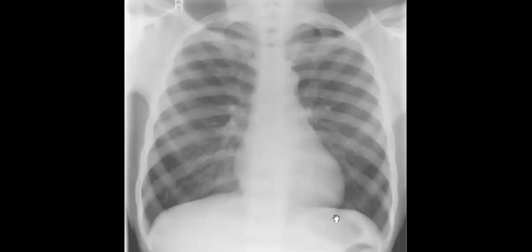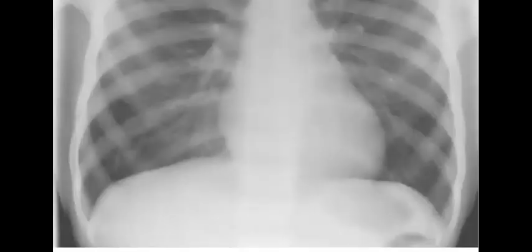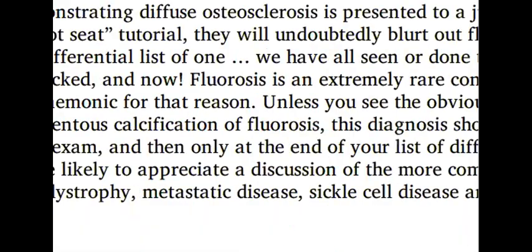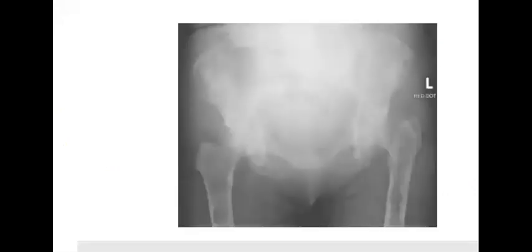But maybe you can find surgical clips, maybe if this patient did splenectomy. Okay. So large spleen, myelofibrosis, they like it in the exam, sickle cell disease. Let's just go to the next case.